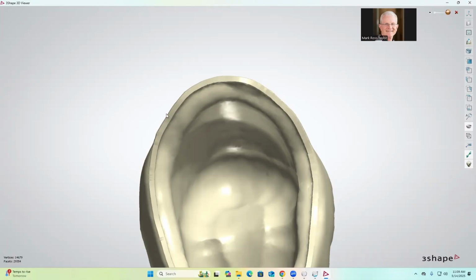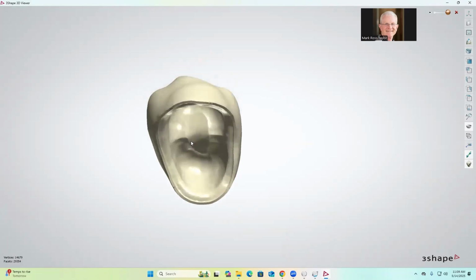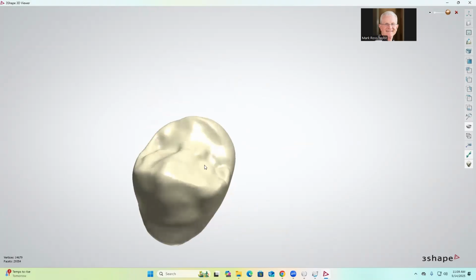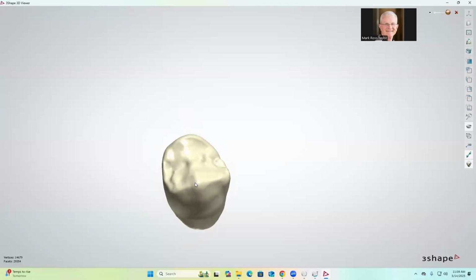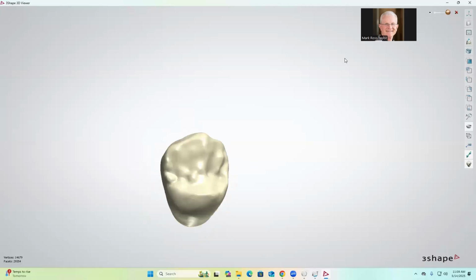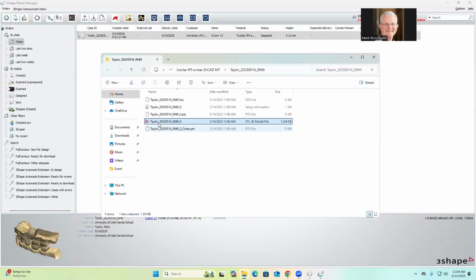That's there for the safety of the milling process. But again, when you bring this back to the normal size crown, you can't even see it. So don't get wrapped up in the weeds when you're trying to finish certain things out. This will be finished out with a rubber point when you hand finish this. Once that's done, we're ready to go. We've explored it. That is the crown. So all we're going to do at this point is close that down.